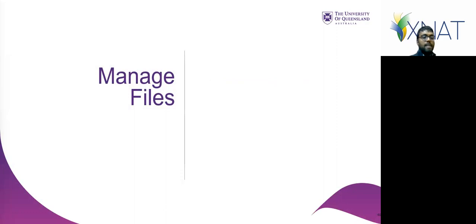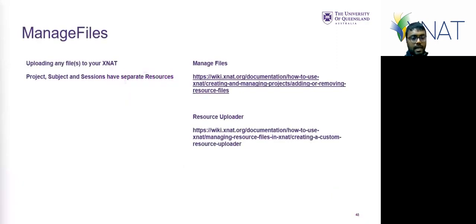So I might look at managing files. So far, everything we've been talking about is regarding DICOM data. So this is more to do with other types of data or arbitrary files. There's two things we're going to look at, and I might actually just look through them live. So this is about uploading any files, and we're going to look at something called the manage files option and the resource uploader.